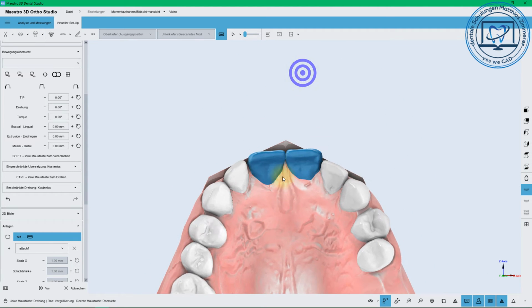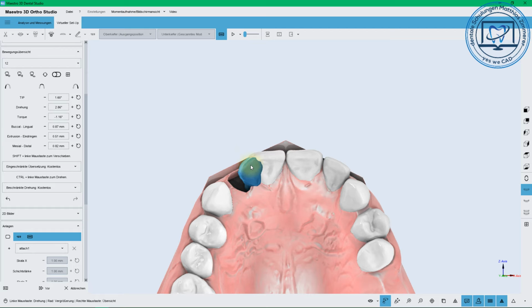And on the left you also have the possibilities with the plus and minus buttons to make a fine adjustment. Normally it makes sense to take the tooth to the place you want and make the fine adjustment with the plus and minus buttons. I think it's normally the fastest one. Also beware, don't move the tooth alone. It's always in rotating. That's why it is so necessary to know where the roots are.